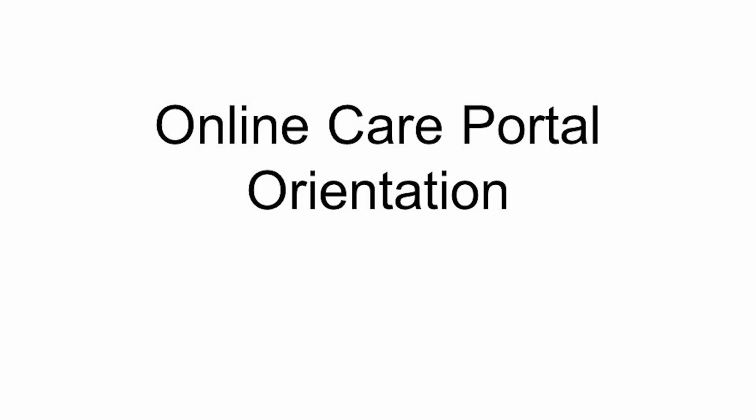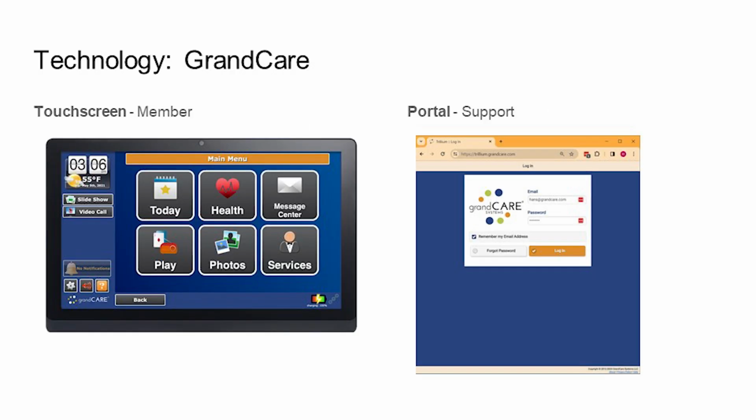We mentioned that the member is the one that primarily utilizes the touchscreen. On the other hand, if you're a person that's providing support, the primary piece of technology that you'll be working with is the portal. So let's understand more about this portal.